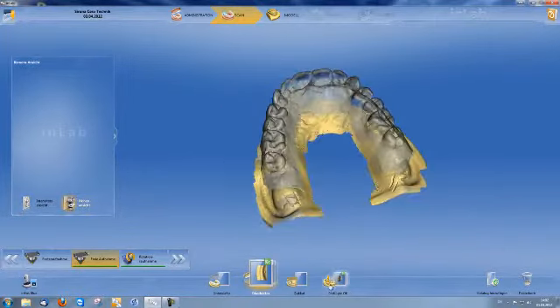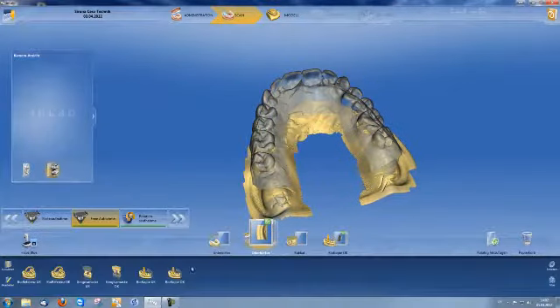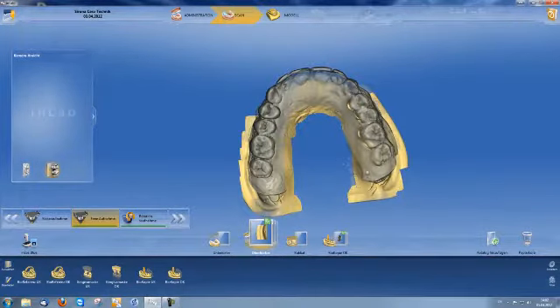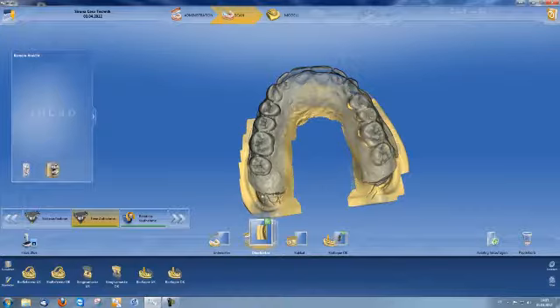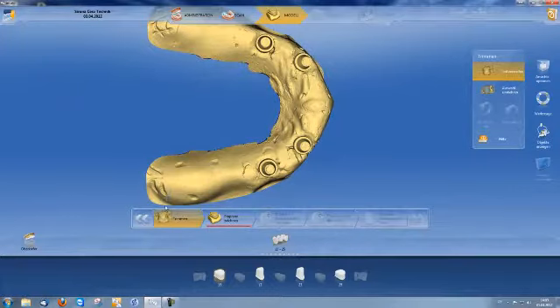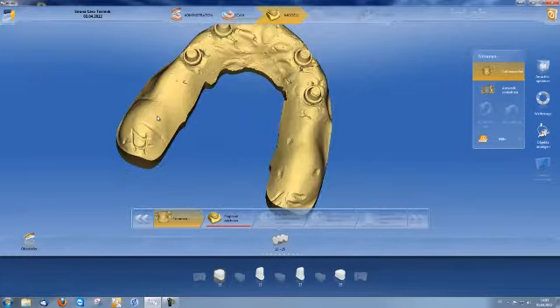and in BioCopy lower jaw, a wax-up was added under Add to Catalog. In this case, the final prosthesis. The software has calculated this automatically using small reference points. We then enter the model mode, where I am able to trim my restoration again should I so desire. This is not expedient in this case.